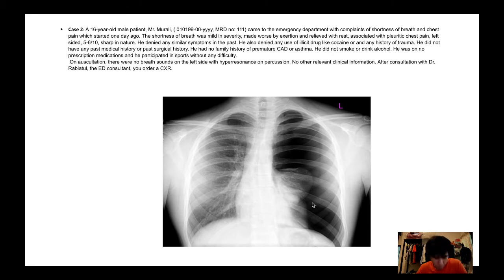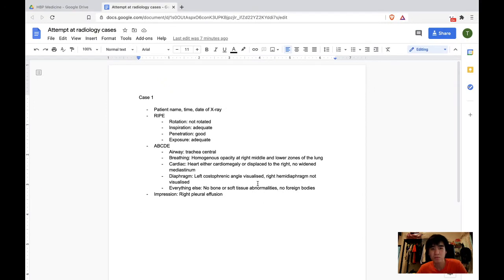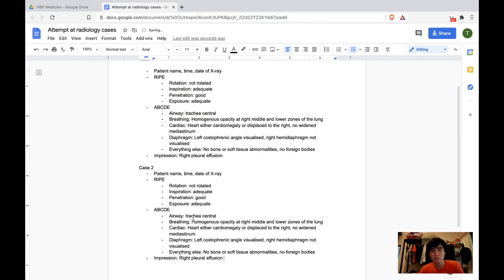Okay. Do I have time to write? Yeah, I do, right? Okay, let's do this. Can I just copy this over and then edit based on what is different? Penetration, good.